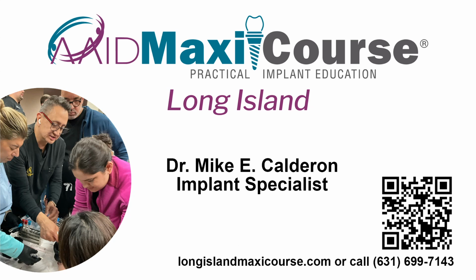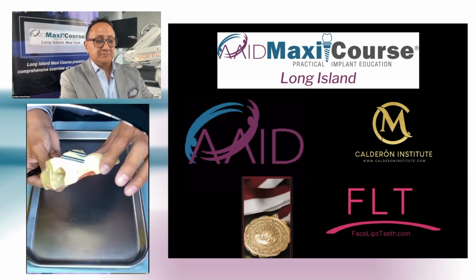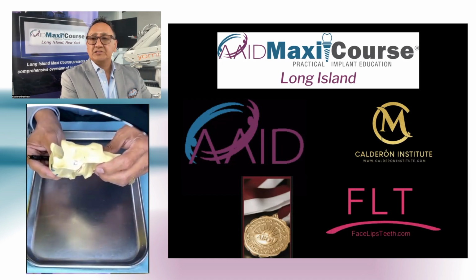I have a little model here. And if you can see with the model, what we're going to do, I have zygomatic implants here. Okay. So they go up this way, zygomatic implants. And we're going to also show you regular sinus.